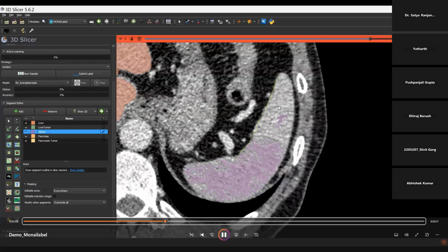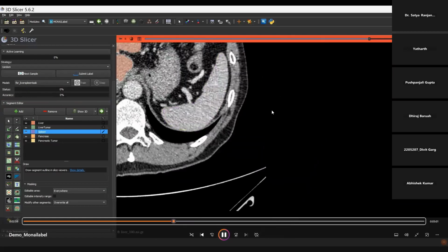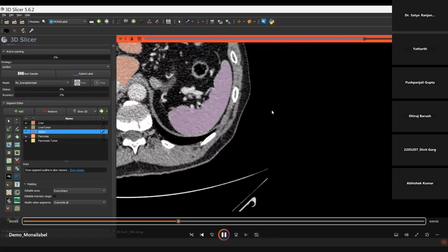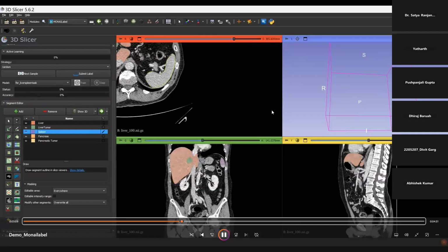So I just showed you the demo of the pros and cons, and which one is useful and which one is faster, because annotation takes time, right? So you should try to use the method which is convenient and faster in your work. And it should be correct.